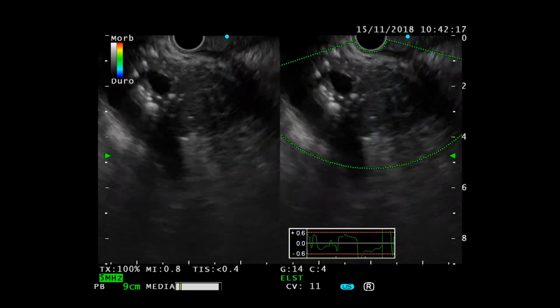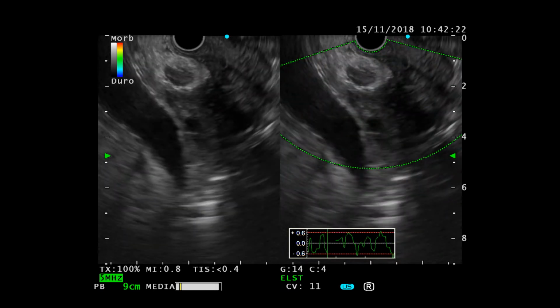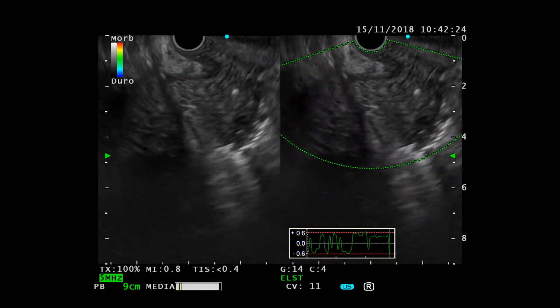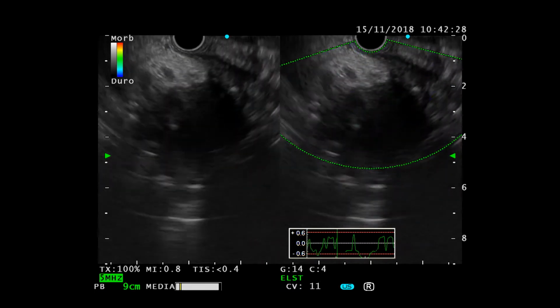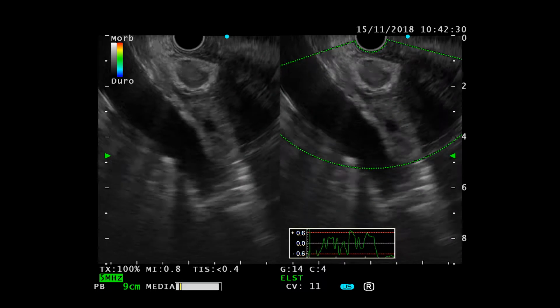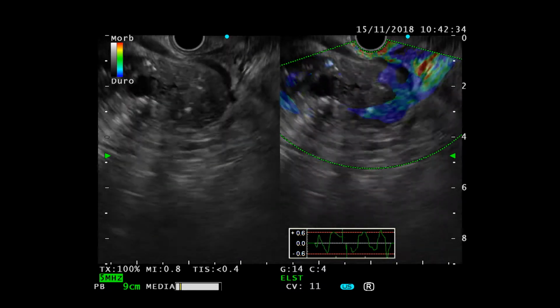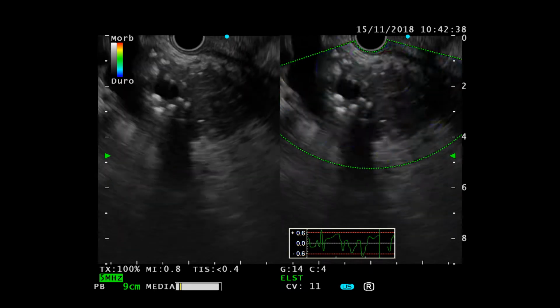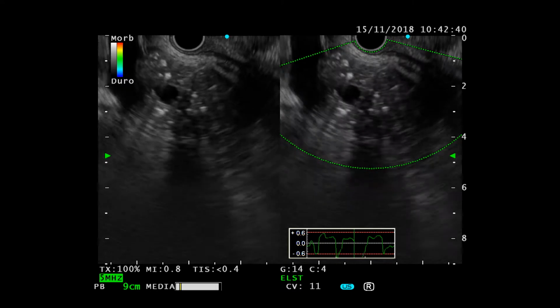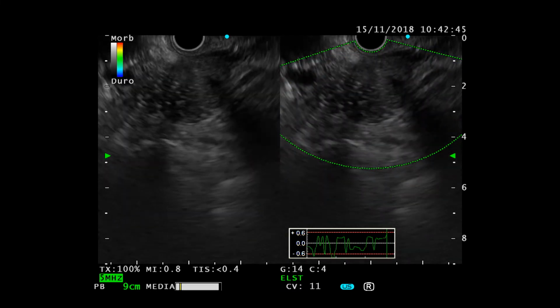The reason I would consider doing a biopsy in this situation is what Thomas demonstrated, that there is an area of abnormality in the head/uncinate process which does not have as much calcification as the rest of the gland. So there is something abnormal that fits with his symptoms, which suggests that something has changed over the last few months. So that is the reason I would consider doing a biopsy.